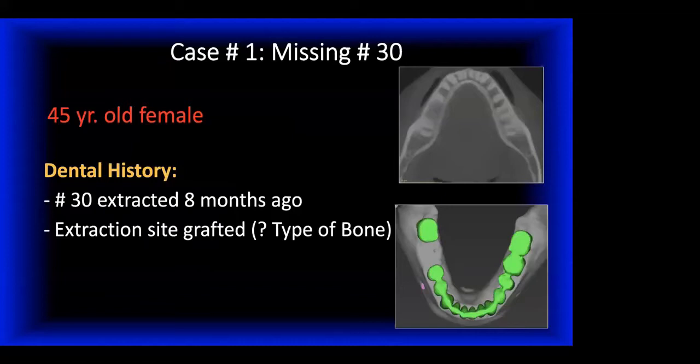This was kind of interesting. The patient had number 30 extracted 8 months ago in a different state. They had recently moved, and this is a new patient to our doctor's office. The extraction site was grafted.